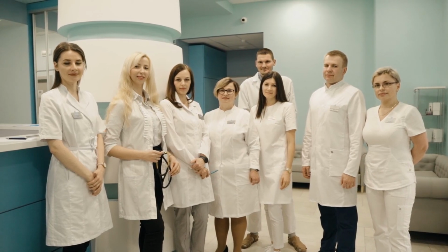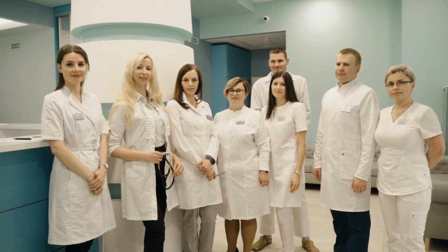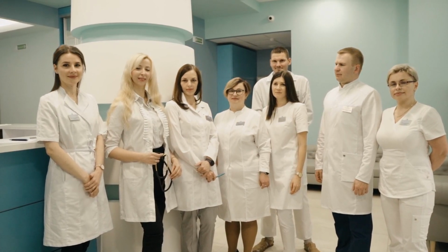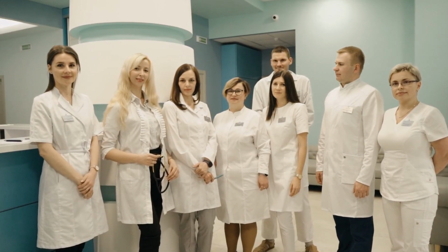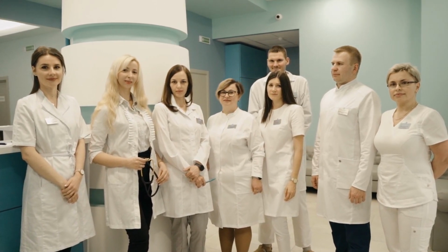Each piece of information helps you see the bigger picture, and the better you get at solving the puzzle, the faster and more confident you become. It's like you're training to be a medical imaging ninja. Let me know if you have any questions or want to dive deeper into a specific area.